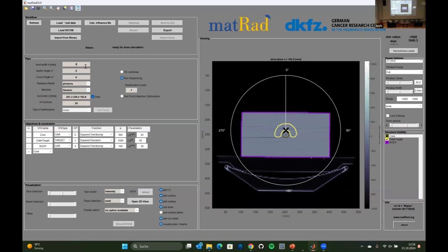Of course, there's also the limitation of how big your collimator leaves are. It doesn't make sense, if your collimator leaves are 5 millimeter equivalent size, to create beamlets that are 1 millimeter small if you cannot even physically create these sized beamlets. Then the sequencing algorithm would need to change this anyway. So let's stick with this. Usually 5 millimeter works. If your computer is very slow, you could consider increasing this a little bit, then you get fewer beamlets and faster results. So that's the setting.